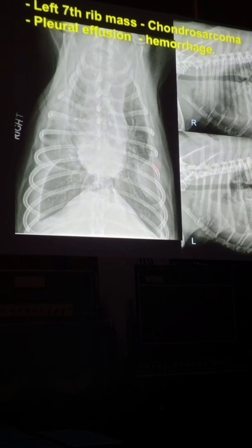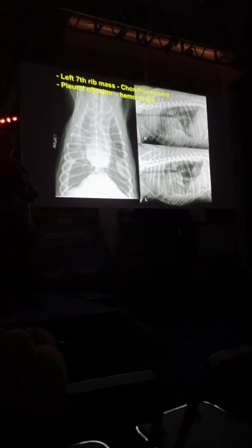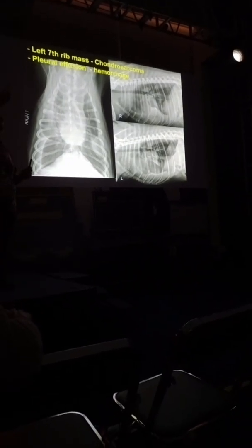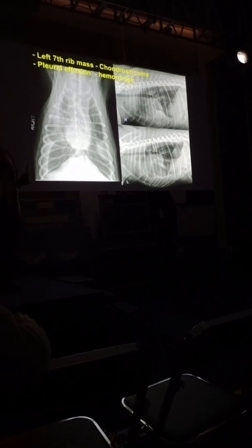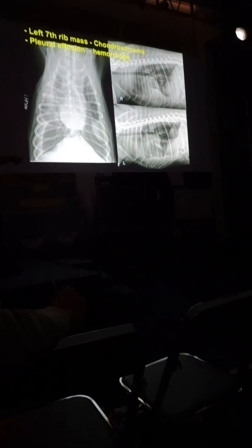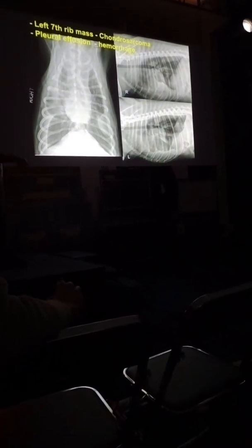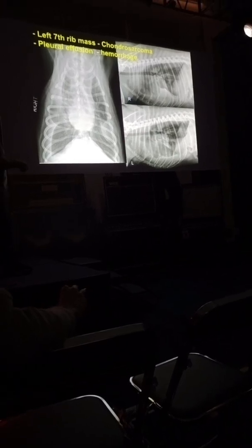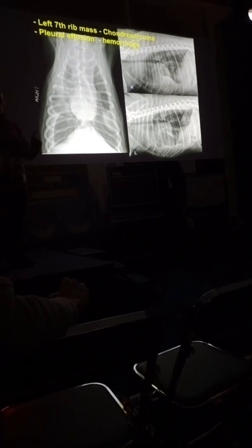What do we look for? Lost the rib. I look at every rib. I take my finger and go up and down every rib. I know you think that's hard to believe, but I promise you. Because here's a case. If you recognize the rib was partially gone and you recognize the difference in appearance here and here, and the left side compared to the right, you can find out why.